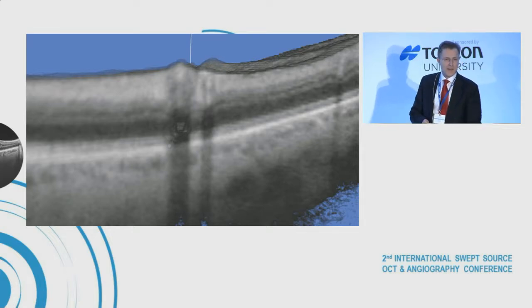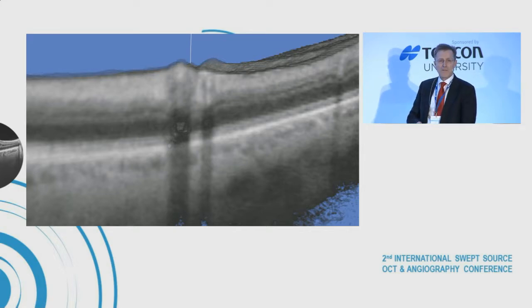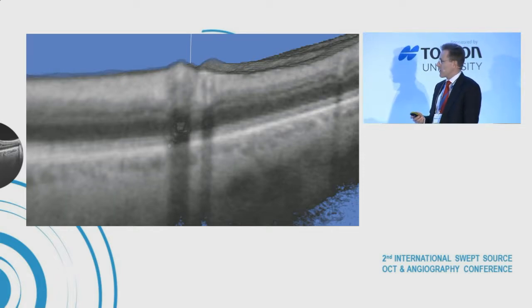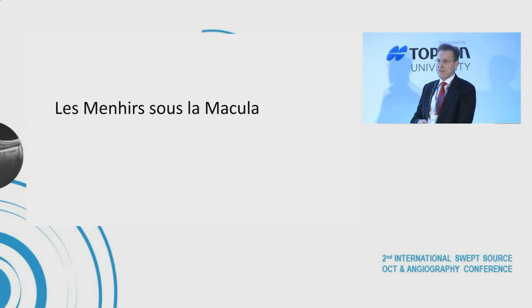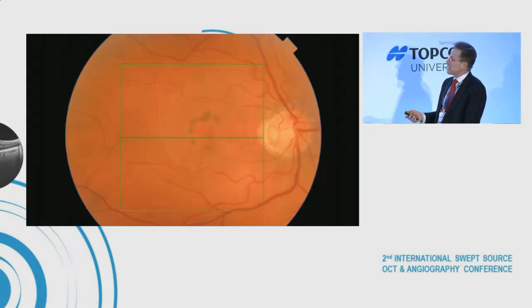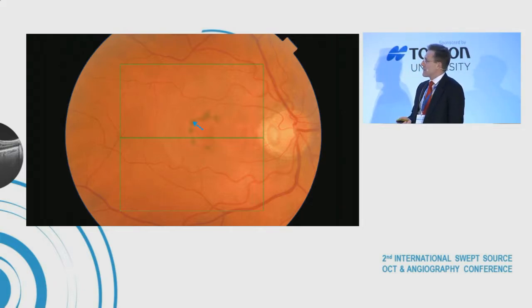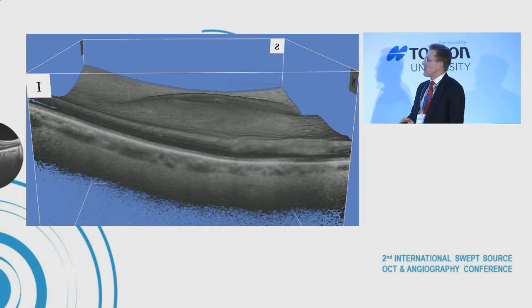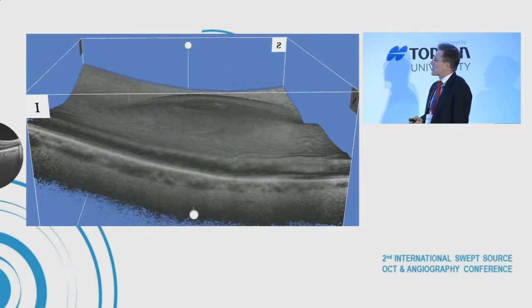It's a good sign because the reflectivity of the blood is high when you have blood that is flowing. If it comes to a standstill, then the reflectivity will go down, and you can diagnose conditions such as ocular ischemic syndrome. And here's a patient who has sort of like a Stonehenge underneath his macula. Look at the black dots here in a semicircular ring, and here they are, pigmented they appear, although that may be a matter of reflection, of retroillumination.